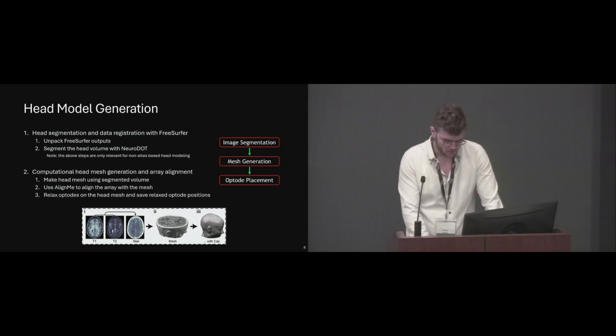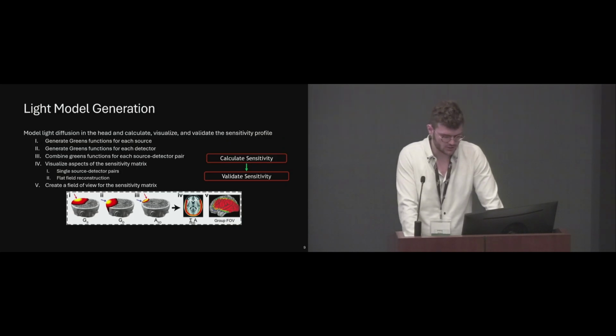So we do have light model generation after that. So this is when we go into calculating how the light diffuses through the head, and then we validate and visualize the sensitivity profile. So that's what Joe was talking about the other day and Adam was talking about this morning.